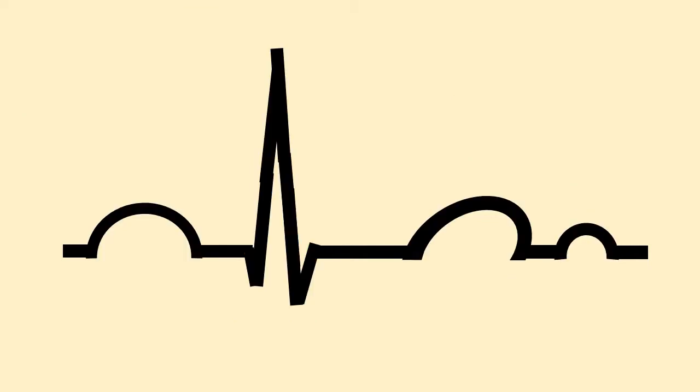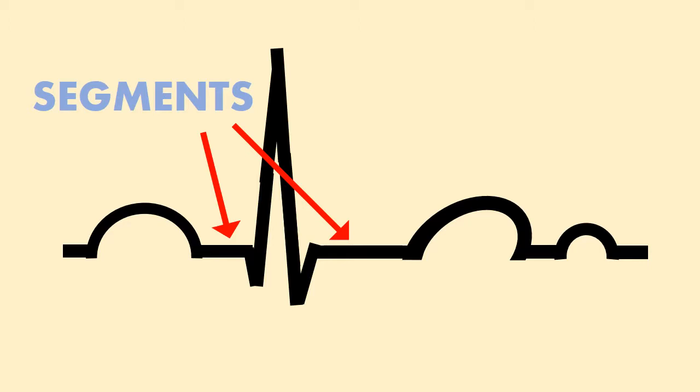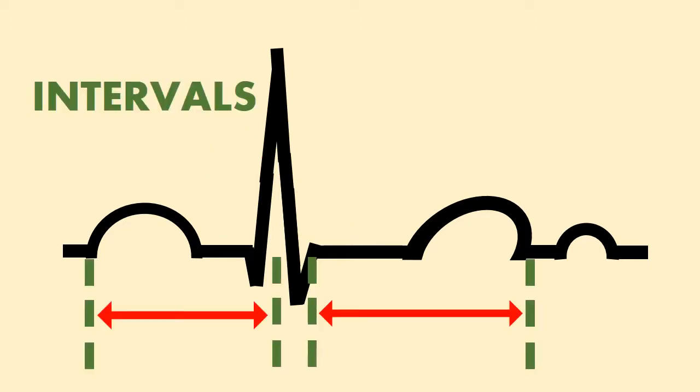Segments are the flat isoelectric lines between the waves. Intervals include both waves and segments.